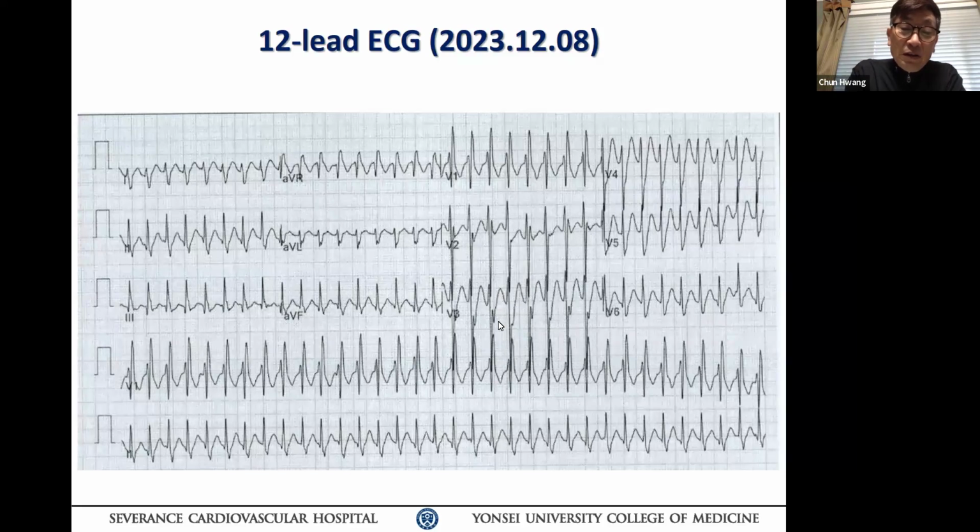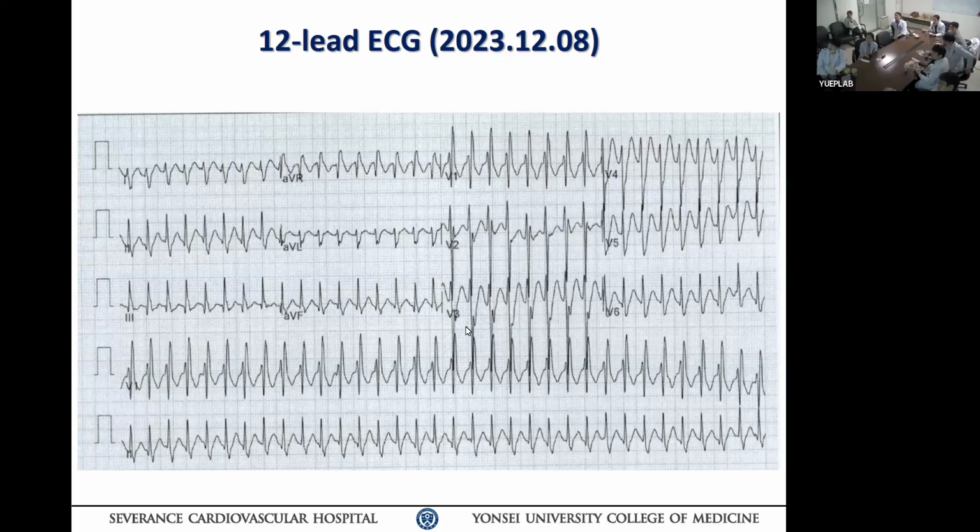You see that terminal R in V2 disappear. And that's happening also a second beat after that, two beats after. One more to the left. Or keep going to the right. You had the first and normalize again, and the next one. See, the same thing happening, but different degree. Then also in the terminal QRS, there's a notching, very unusual notching.